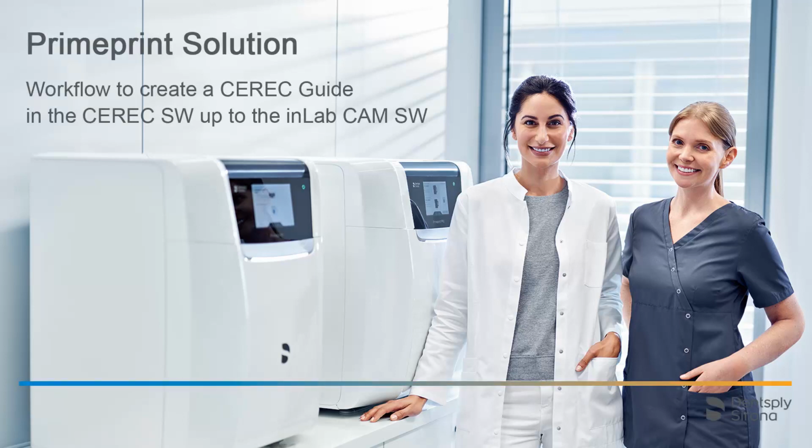Welcome to this video tutorial on the topic of Primeprint solution. This video demonstrates the workflow to create a CEREC guide. We will run through the CEREC software up to the in-lab CAM software.